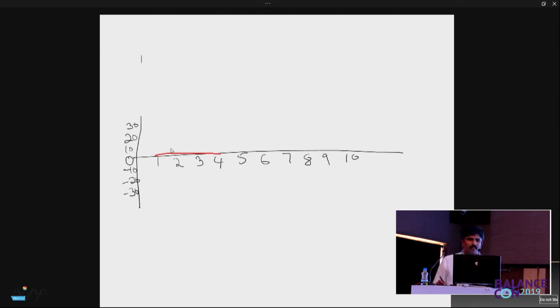Now, after a proper calibration, if the tracing instead of here came here, what does it mean? The eye is looking at something to the right, correct? Now, if it comes here, it means the eye is looking something further to the right. And if it was here, it is to the left, and if it is here it is much further to the left.